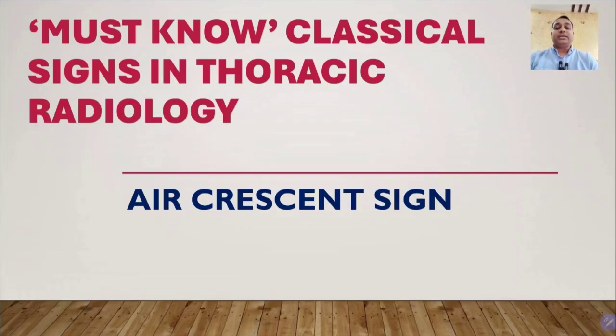In today's lecture, I am going to discuss a very important and interesting sign called the air crescent sign. I will discuss what the air crescent sign is, how it looks, how to identify it radiologically on chest X-ray as well as on CT scan, and in which different conditions it is present. So let us start with today's lecture.